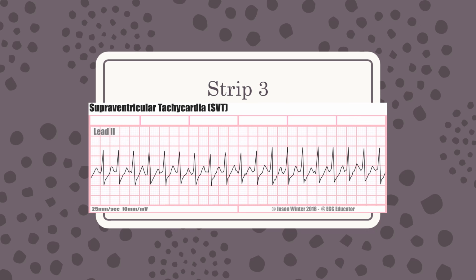Here is SVT. You don't see the stop and start, so we're going to call this SVT, okay? You don't see the sudden stop and start. So you've got a rapid rate here of over 150. There are no P waves. We're going to call this SVT.